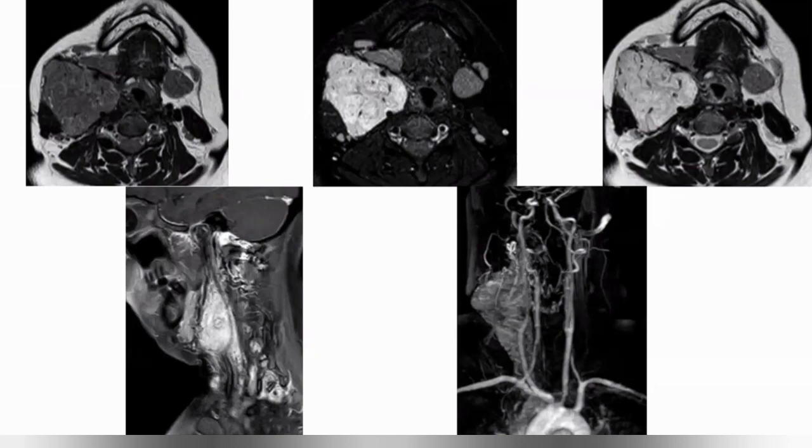So nicely described case. I will just go over this. But in the MRI images, it's not clearly splaying the carotid vessels. It confused me whether it's paraganglioma or not. Basically, this sagittal post-contrast is helping you to differentiate this splaying of the vessel. You can see that this vessel is being splayed by this mass, and this is basically the common carotid artery coming up and bifurcating into two vessels here.